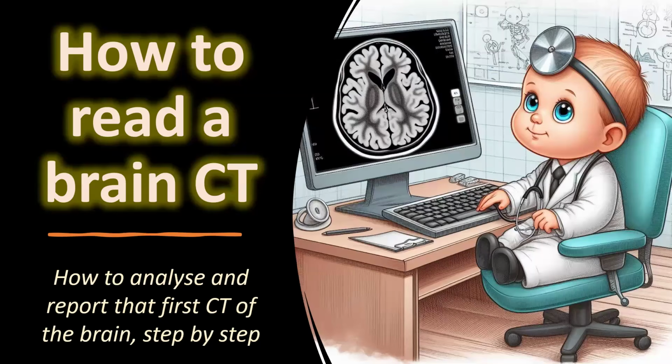Neuroradiologist in Ghent University Hospital in Belgium, and welcome to this presentation on how to read a brain CT. This presentation will cover the basics of analyzing and interpreting a CT of the brain and is mainly aimed at medical students and young radiologists at the start of their career.